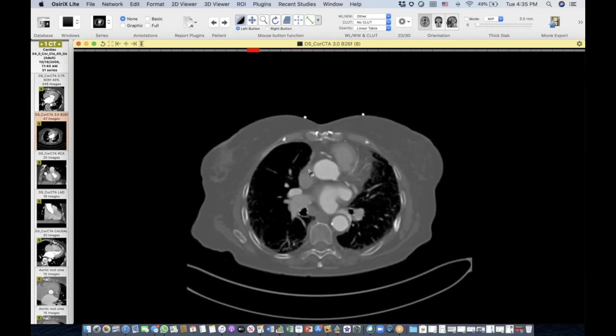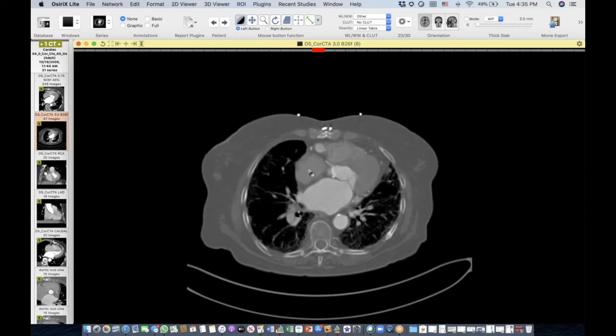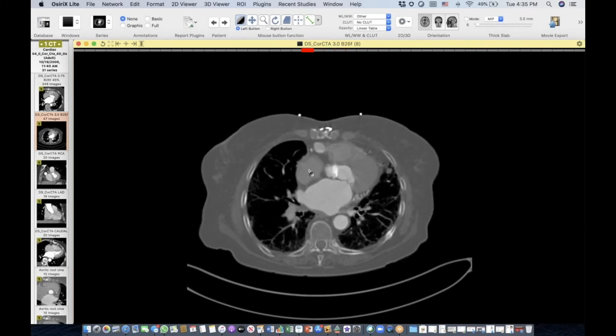Had never seen it though. We've seen pseudoaneurysms usually around the aortic valve, and they're not that infrequent. I mean, they're not common, but we do see them. But I had never seen one around the tricuspid valve, so just a little show and tell of that one.